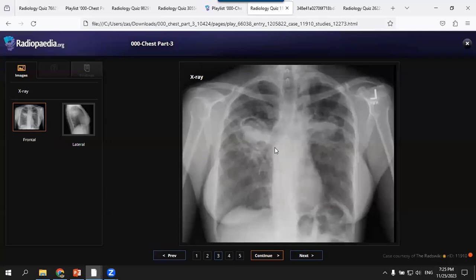Upper progressive massive fibrosis. What else? Aspergilloma can occur in any pre-existing cavity, such as a cavitating metastasis, emphysema, pneumatocele, previous laceration cavity, or pulmonary infarction cavity. Or TB. Okay. This was mycetoma on top of a sarcoid cavity.